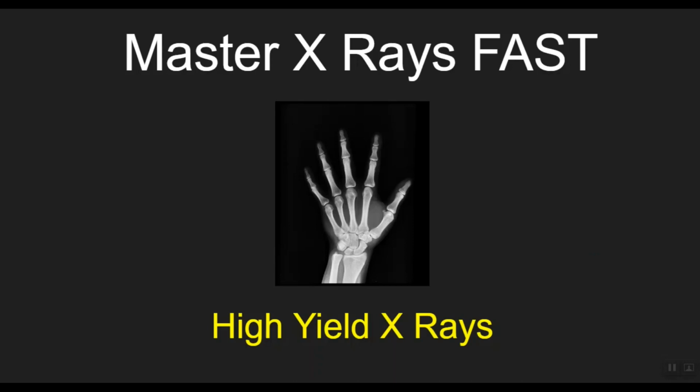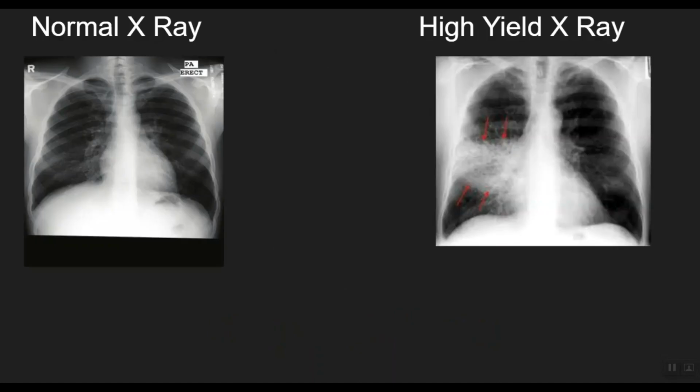In this video, we're going to look at some more important x-rays, not only for the exam, but also for the daily clinical practice and emergency department. If you haven't watched part 1 of this high yield x-ray series, I highly suggest you watch that video as well.